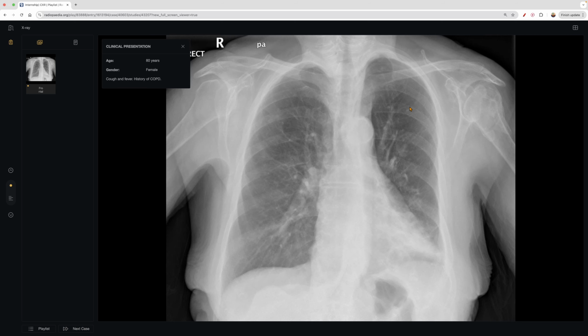So this 80-year-old female, let's look at what we have. Quick go across, not seeing any fractures here. Oh wait, we do see a fracture. Right, so that's why sometimes you want to keep in mind what the patient is presenting as. I think they had mentioned this may have been a subacute fracture. So it's maybe already known, but nonetheless, you want to take note of that. You don't want to be the person who misses it.